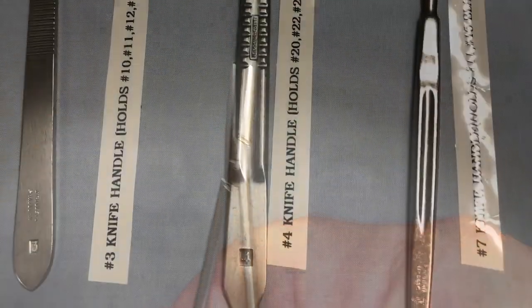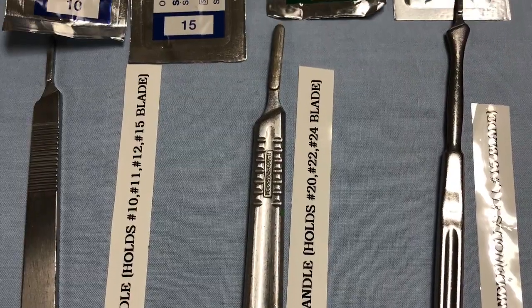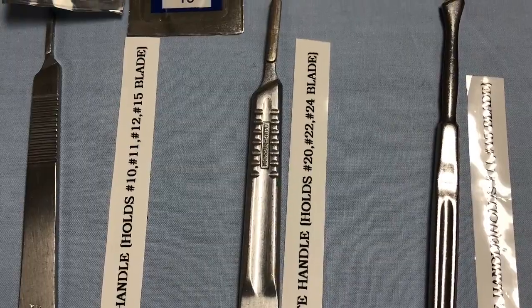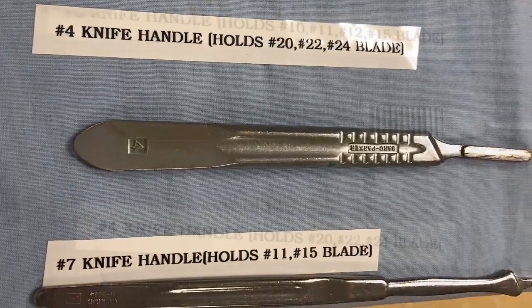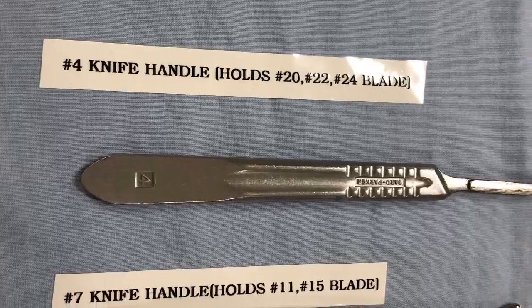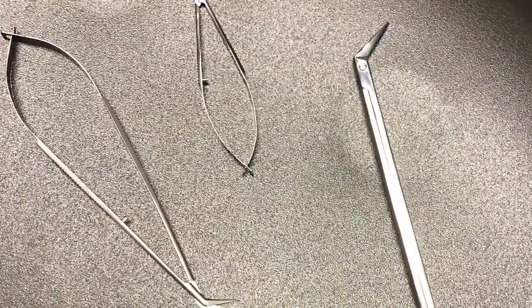Knife handles. These are for holding surgical knife blades. Remember to pass and receive back with care. Keep your fingers out of the way. The number 3 knife handle holds the number 10, 11, 12, and 15 blades. The number 4 knife handle holds the 20, 22, and 24 blade. And the number 7 usually holds the 11 and 15 blade.